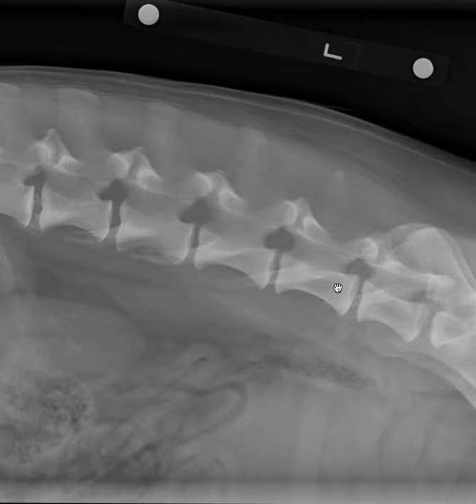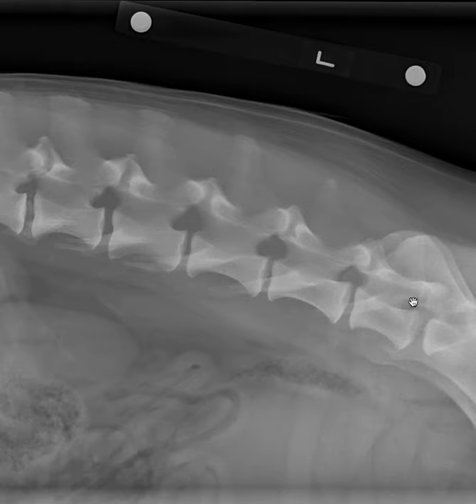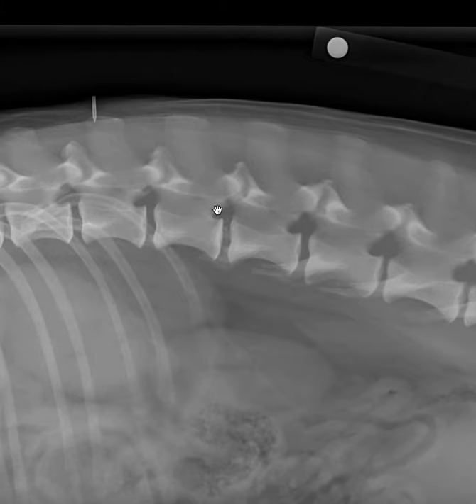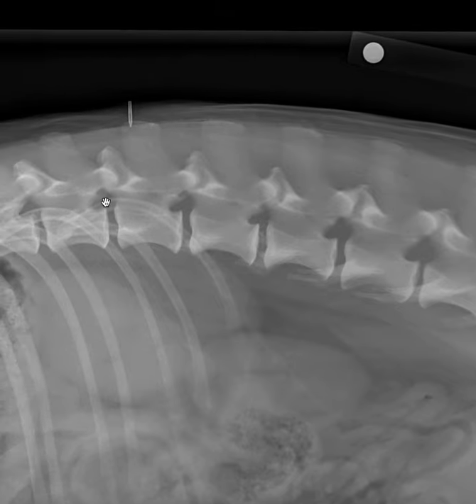One thing that I also assess, which is sort of a crossover between when we looked at alignment and our bone and cartilage assessment, is I actually then drive my eyes and use my mouse to go all the way down the vertebral canal. Remember that in a patient with T3L3 myelopathy, we're of course concerned that something could be going on causing compression within the vertebral canal. The vertebral canal margins show up like this, with the dorsal aspect being a very thin sort of white line on the edge of the bone and the ventral aspect looking like this. So I follow those lines the whole way down the vertebral column.